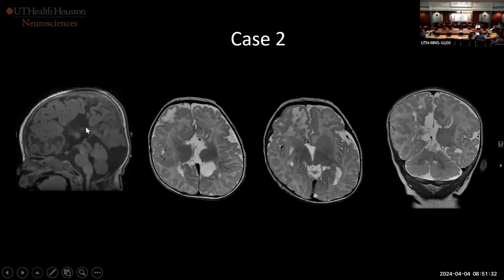I think it's almost completely gone. You see the horns of the bullhorn here, but they're a lot of the times associated with cysts or with lipomas, and they don't come alone. This one has a lot of cortical heterotopia and anomalies with some dysplastic frontal white matter. So if you know these rules, it's going to be easy to talk.